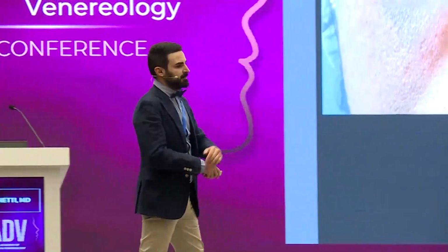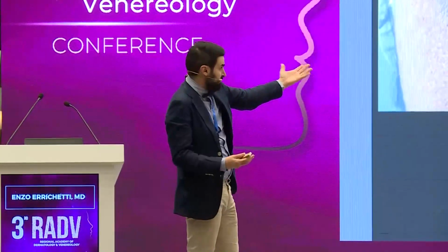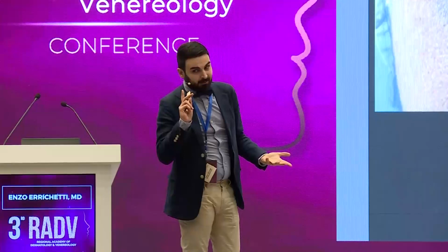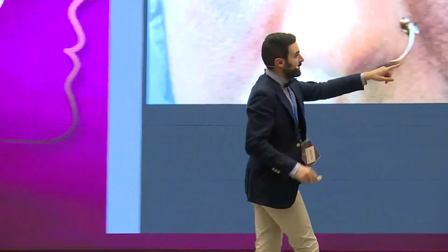Okay, and this. You told me melasma. It looked like melasma, I agree. Lichen pigmentosus, yes, could be, because we have brown dots around the follicles, but take a look here.